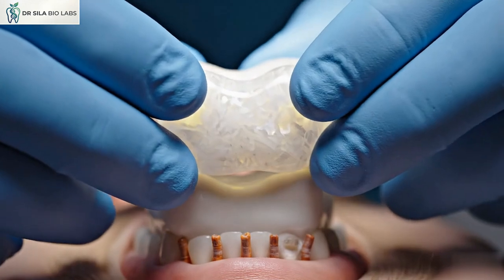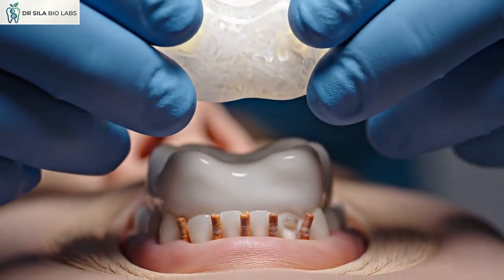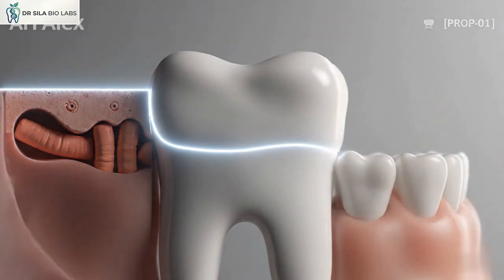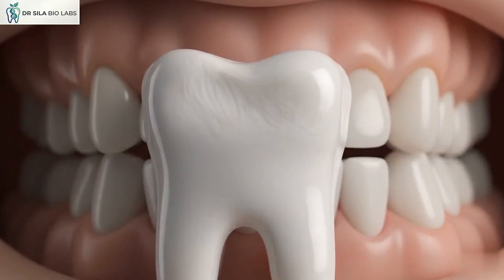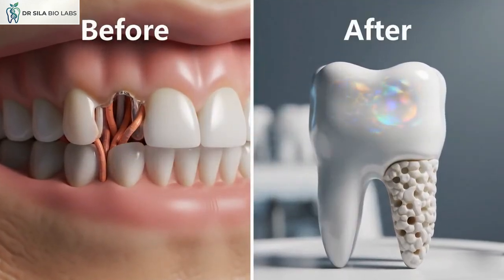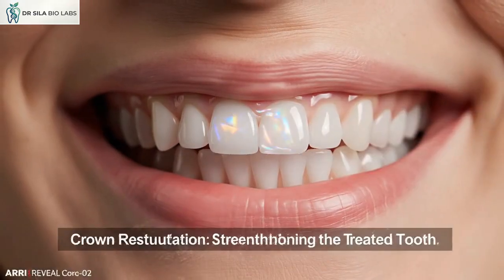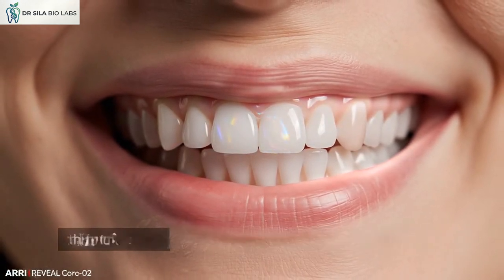The crown covers the entire visible portion of the tooth, distributing chewing forces evenly and reducing the risk of fracture. The core buildup reconstructs the tooth structure, allowing the final crown to provide complete protection and a natural look. Once the crown is securely cemented into place, the treated tooth can function normally again.